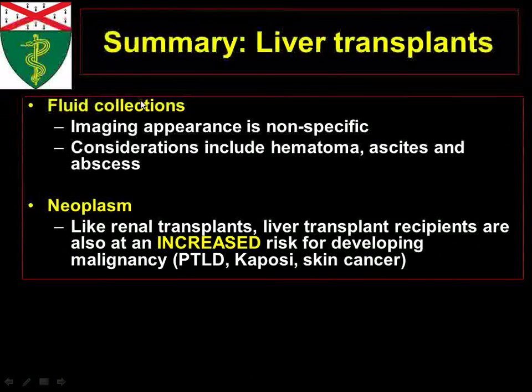Fluid collections, remember the imaging appearance is often non-specific. If you see air, we're worried about abscess. Other than that, it could be any number of things, most likely hematomas. We just use ultrasound to follow them and hopefully use it as a modality to drain them if needed. And remember tumors, PTLD is something to think of at the back of your mind. It can happen at any time, and it can look like lymphoma. So single mass, multiple masses, infiltrative mass, adenopathy everywhere. Think of PTLD in transplant patients.